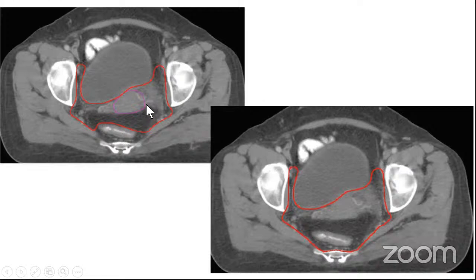So the moment the disease has gone beyond stage 3B, which means the disease has gone up till the lateral pelvic wall, there is high risk of involvement of the uterosacral ligaments. So this part is from the uterus to the sacrum. When there is a high possibility of uterosacral ligament involvement, we will have to include the entire ligament into the picture. So we'll have to take a sleeve down and then include. So in cases of stage 3B, we'll have to include the rectum into the entire volume, because otherwise, the rectum will appear as an isolated island of OAR tissue within the PTV volume.